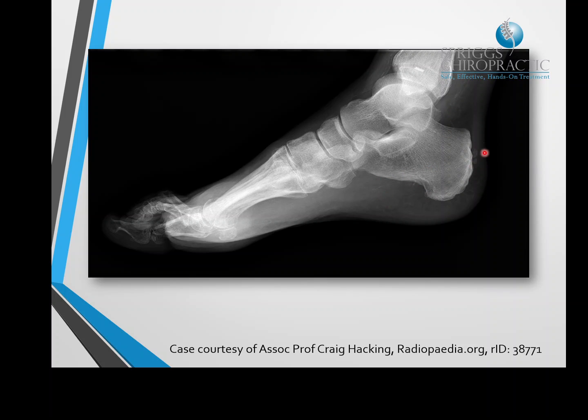We've got a couple of loose bodies back here too, but otherwise this looks pretty innocuous. For the more astute clinicians out there, you'll be able to see quite a lot of soft tissue swelling, especially around where you would expect the joints of the big toe to start. So this is your giveaway with this particular case.